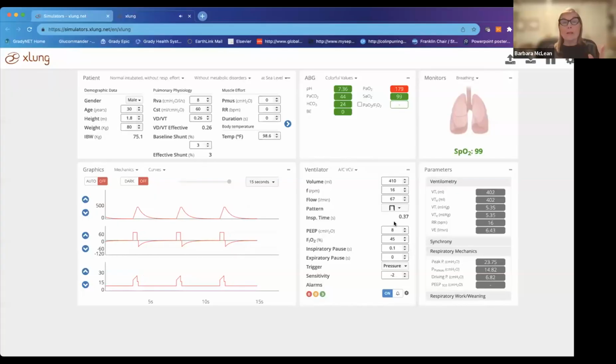So that's what you're seeing here. This is auto PEEP. The PEEP that is dialed is 14. That's the PEEP that we were giving, but he actually has an auto PEEP that's much higher. You're not seeing that number there. Unfortunately, this was the only picture that I could have. So now we're going to try to create it with our simulator. I'm going to go back and share my screen again with my simulator, and I'm going to try to show you as best I can auto PEEP.